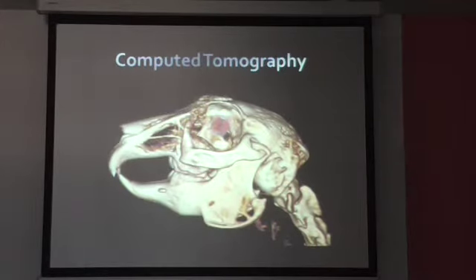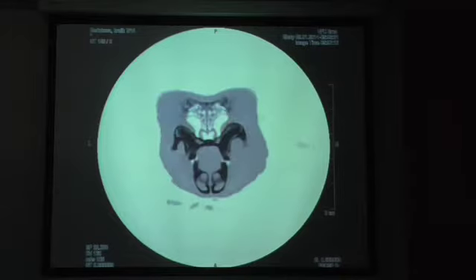So this is 3D modeling. It's good for effect, but again, not for the right diagnosis. You could just put it in inversion, so you could see here swollen soft tissue.